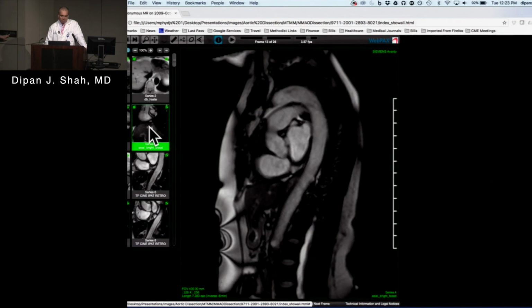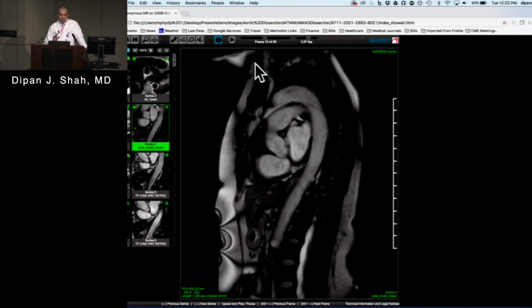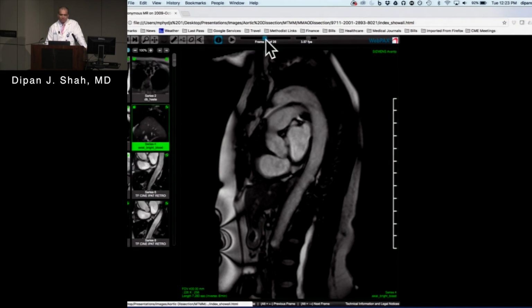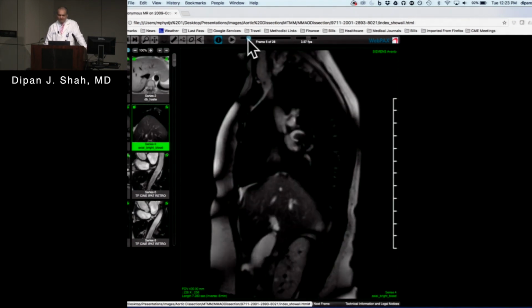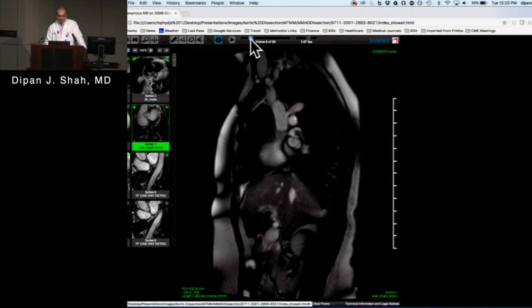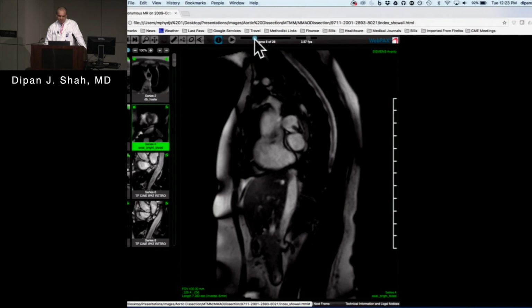Well, the other thing we can do is also we've got not just axial views, we've also got sagittal views as well. So let's take a look at these. Because again, what you want to see, if you're concerned about an artifact, now it's kind of getting unusual that CT scan outside a CT scan here, the initial axial MRIs show in the same location this abnormality. But again, if you're concerned about an artifact, what you want to do is look at it in multiple different orientations. So here now is a series of sagittal acquisitions.